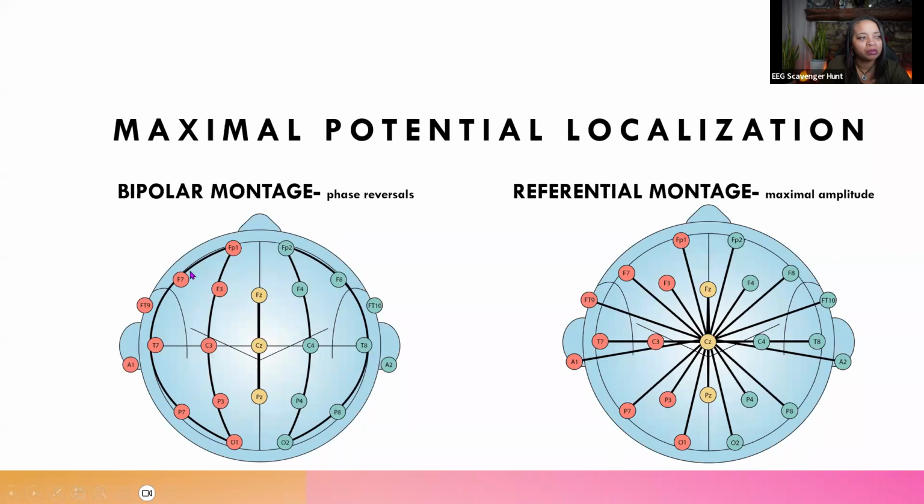If you think about the different types of montages, these become very important for various reasons. As epileptologists, we want to know where the seizure is coming from. Where are those epileptiform discharges maximal? Where is our area of interest? What should we be excited about?